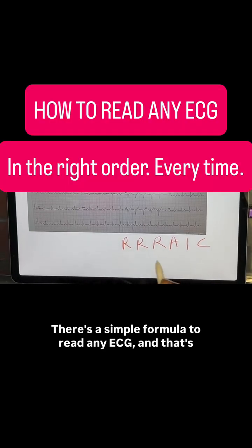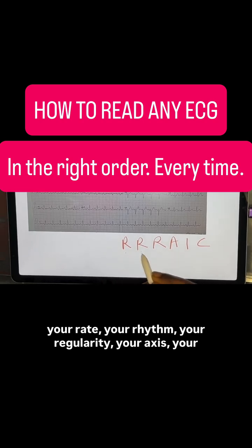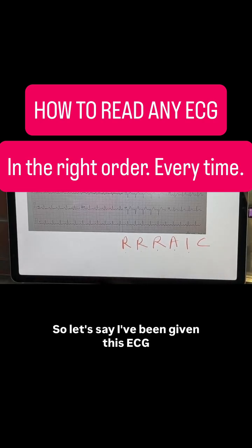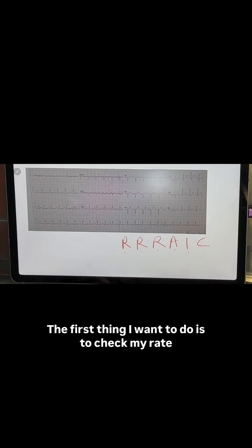There's a simple formula to read any ECG, and that's your rate, your rhythm, your regularity, your axis, your intervals, and your context. So let's say I've been given this ECG. The first thing I want to do is to check my rate.